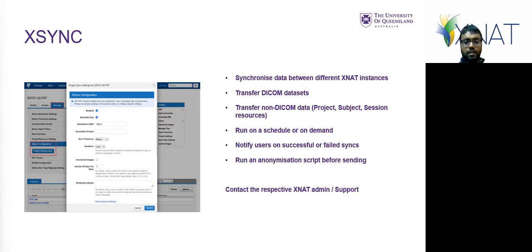Let's just look at a few of the questions for the time being. When you run a pipeline, you'll get an email notification if it runs successfully or if it terminates. So it does give you full notifications. You can run a pipeline across all sessions. I think you can. Oh, you can automate pipeline runs. So we do have a bit of time, so I'll quickly show you the pipeline in place.